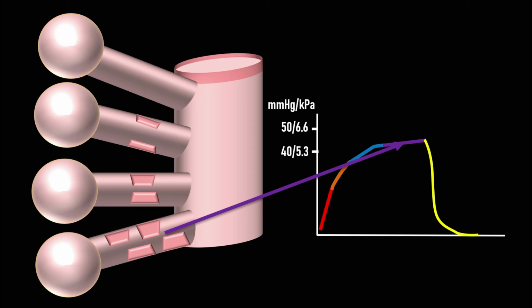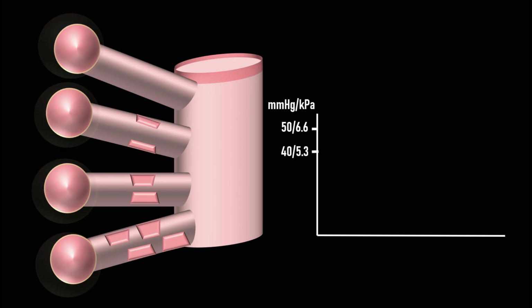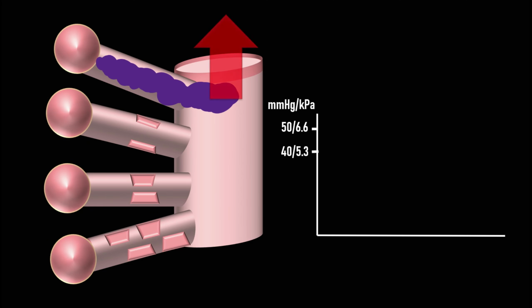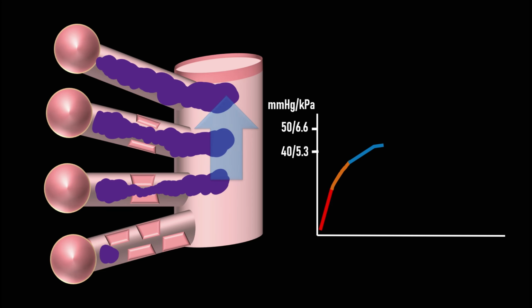And these are, as you can see, easily plotted onto the capnography curve. This will give you an idea of the rate of emptying of lung units along different time constants. Note that the highest concentration of CO2 in the lungs is at end expiration.